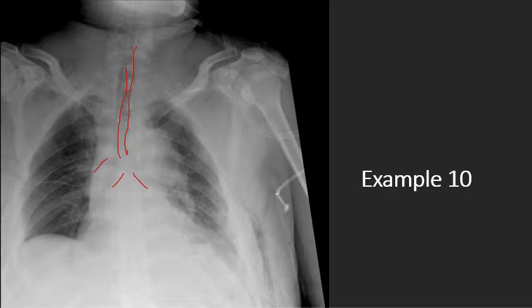Then you go into the B for bones. I don't really see any cracked bones around here, but like we mentioned before, really can't appreciate the lungs very much. And then our C, this is where our heart is. It looks to be a little big, but that may be the exposure of the film. Our hilum is kind of enlarged, but that might be the lung itself. And we'll talk about that in just a second. The diaphragm looks pretty much equal. We have some hyperopacities over here. You have blunting of bilateral costophrenic angles, which is a problem.